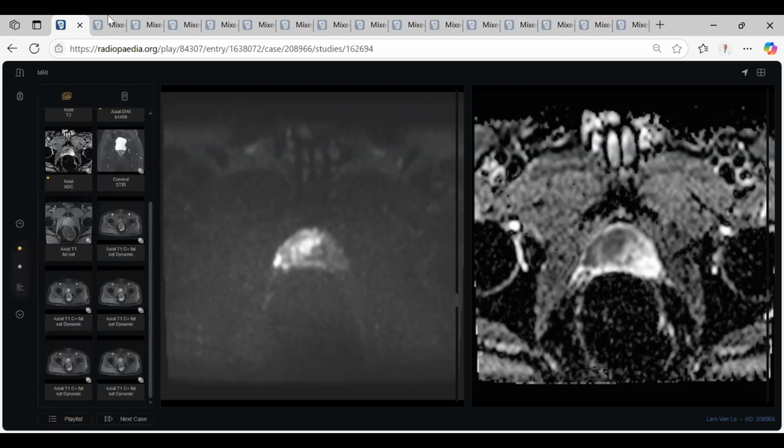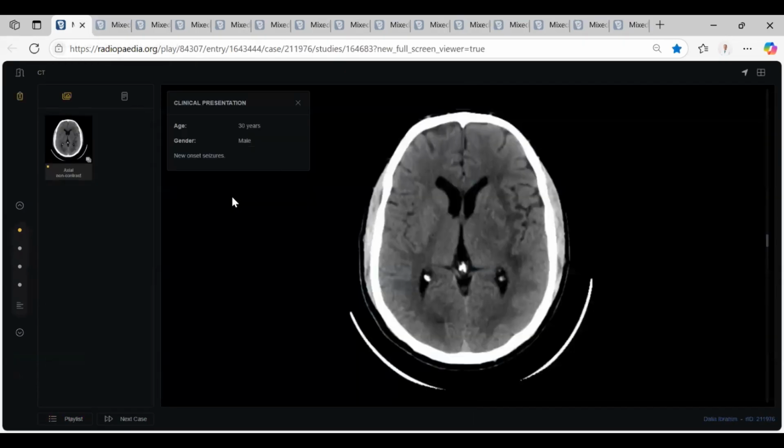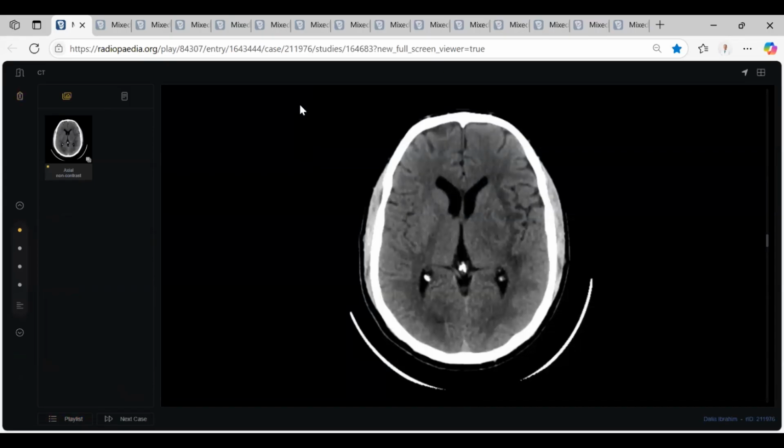Next candidate. Sir, we have a confusion in the ovarian torsion case. Was that ovarian fibroma or ovarian fibroid? It is ovarian fibroma. And what is the difference between fibroma or fibroid? Both of them are smooth muscle benign tumors. Okay, even we are confused. I have a small question. Fibromas are T1 and T2 dark. The lesion was bright on T2 with some shading.